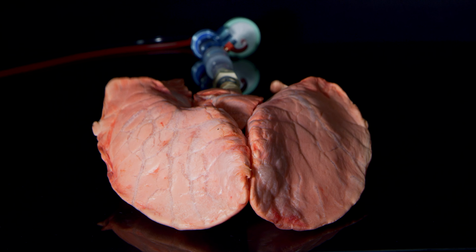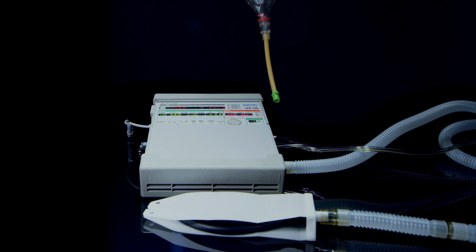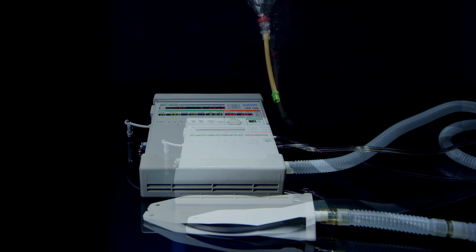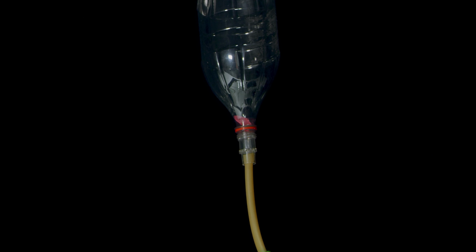by this sophisticated system. In this demonstration, we have a standard conventional ventilator, and it is attached to a standard conventional test lung. The conventional ventilator is then attached to a rigid container filled with confetti, emulating a stiff, non-compliant lung. As the bolus convective gas attempts to flow into the non-compliant rigid container, the confetti barely moves.